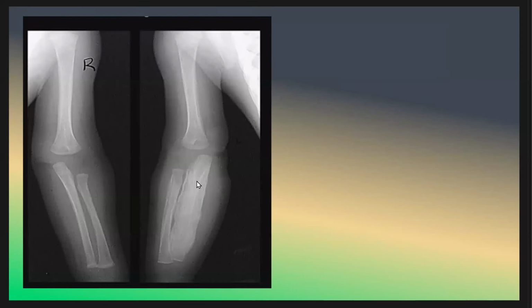Here, this is a case of periosteal reaction involving the forearm, and this is a case of Caffey's disease, periosteal reaction.